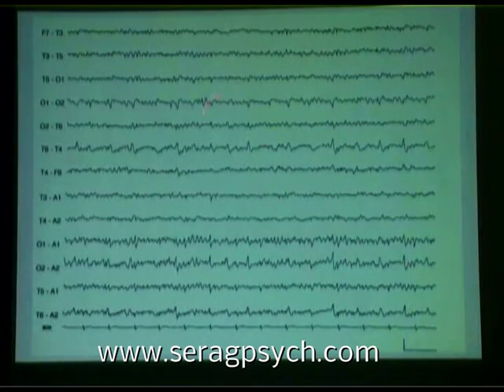But you could argue that the bipolar is a lot better. And then you can also see them there. And now we do have an ECG to show that the spikes are not the ECG. Got to have that. So you don't want to be too rigid about what montages do the best job, because you never know which one is going to help most.